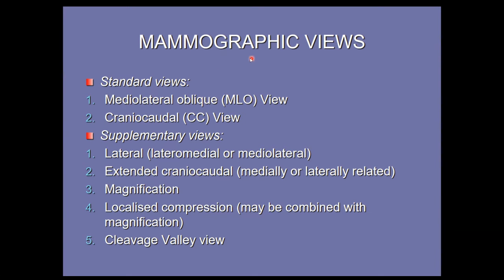Likewise, in mammography, we perform two standard views. Number one, mediolateral oblique view, and the other one is called cranio-caudal. Because if we see a mass on mediolateral oblique, it is somewhat the same as a lateral view. But the only difference is that we are giving some angulation to the X-ray tube. That's why it is called oblique. Otherwise, it is the same as a lateral view.